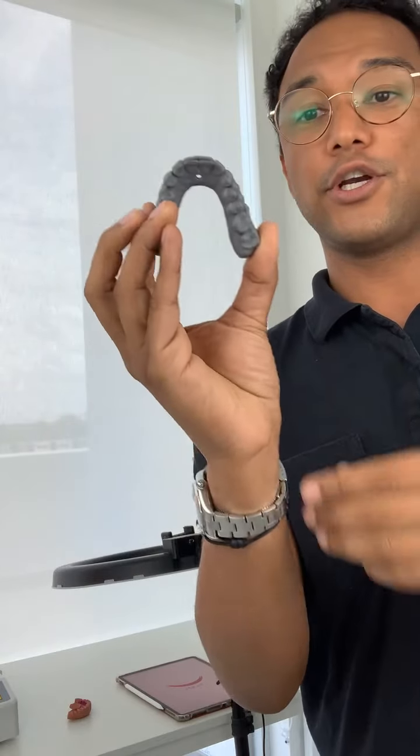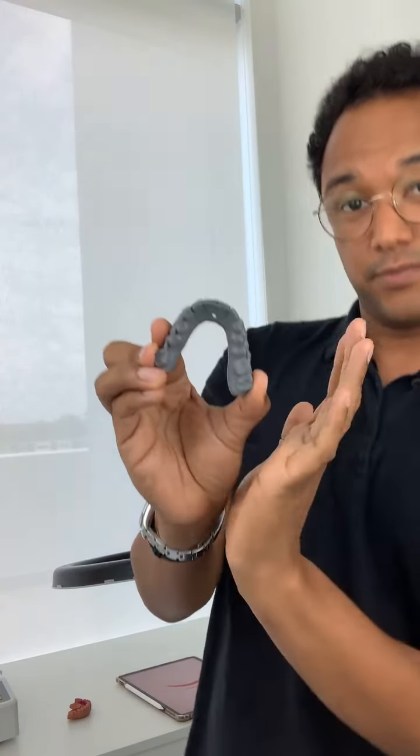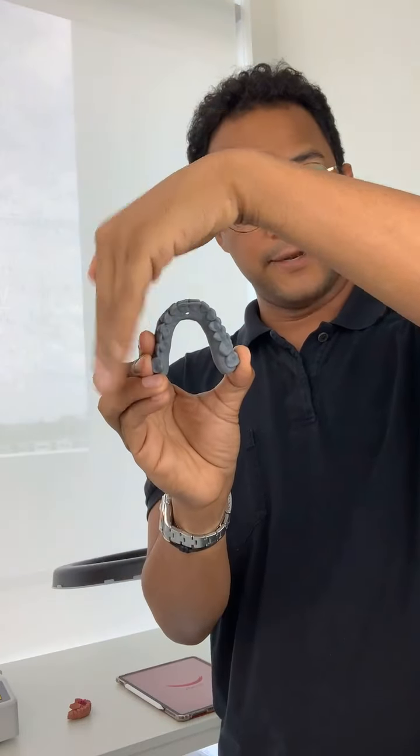If you look at it, if you turn it into the occlusal view, you will see that the curvature is rounded. It goes like that, right? But when you take a picture of a patient, all you can see is a two-dimensional view. So it's only the frontal view.